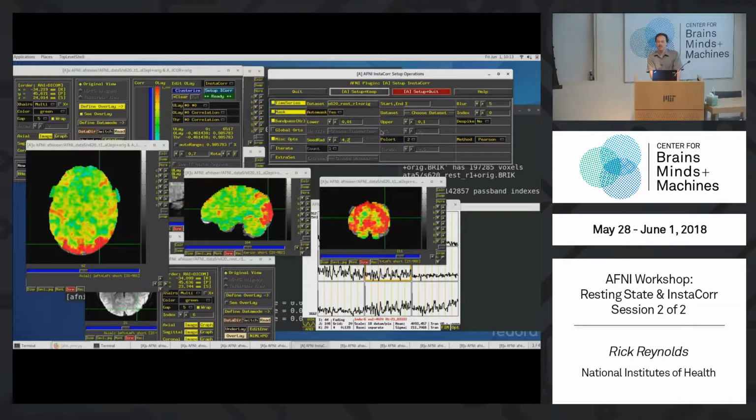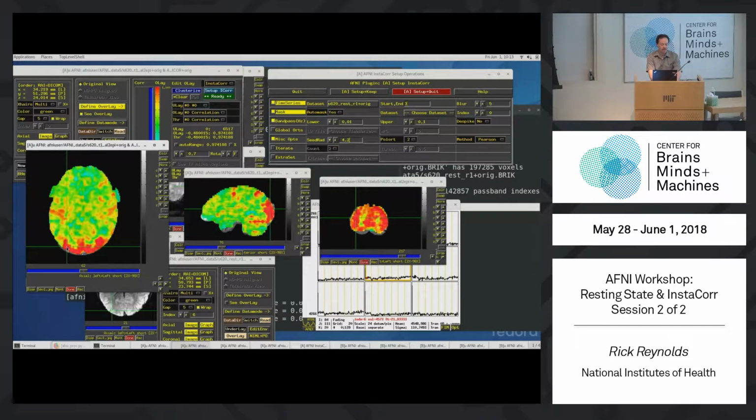Still, that's not fast enough. Ziad Saad whined to Bob about that too. I want it to be more Insta. So now hold your Shift and Control keys down again, and you can click, but not just click, you can click and drag. And oh, you could look at this for hours.